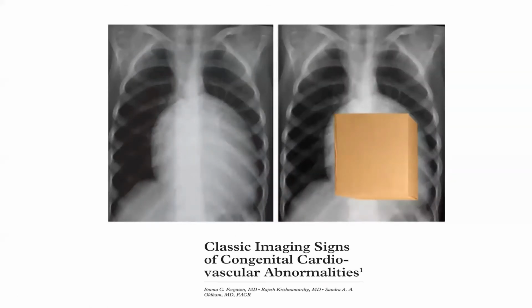And this one is box-shaped heart. Box-shaped heart. Any guess? What could that be due to? Box-shaped heart could be due to what? Hello? Hello? Are you following me? Yes, yes, yeah. Oh, yeah. Good.